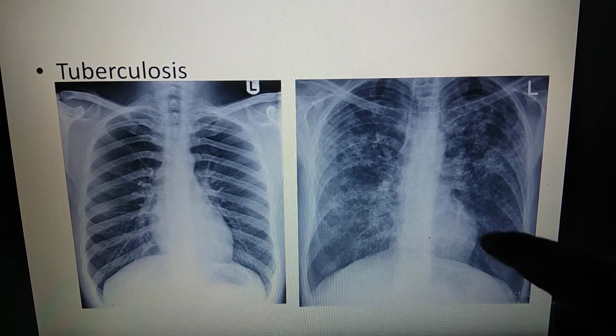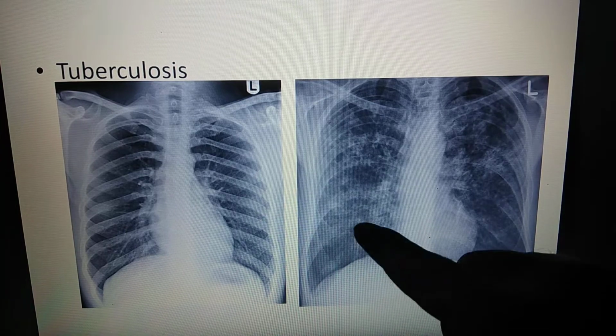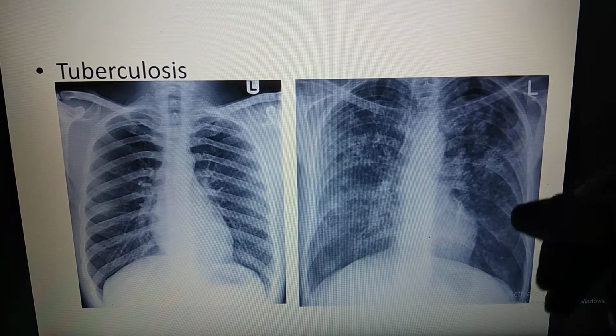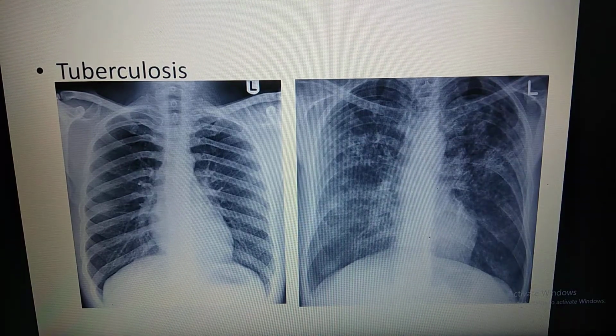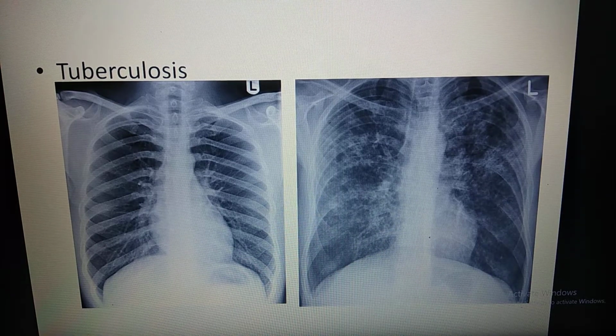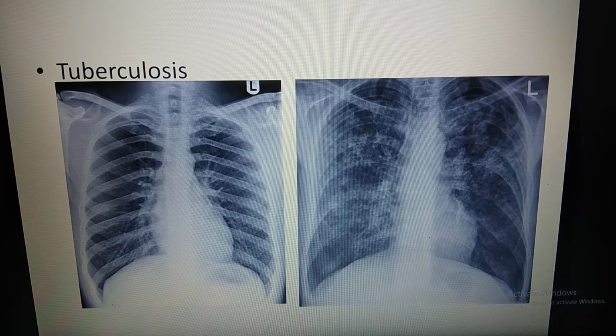Now if you focus on this x-ray, again we'll continue. Angles are sharp. This is the heart, the trachea, the clavicle, but now we'll look for white spots. Yes, we see so many white spots. A white spot here, a white spot there. This is known as opacity. In our country, or in Asia, this kind of opacity is very likely suggestive of tuberculosis.